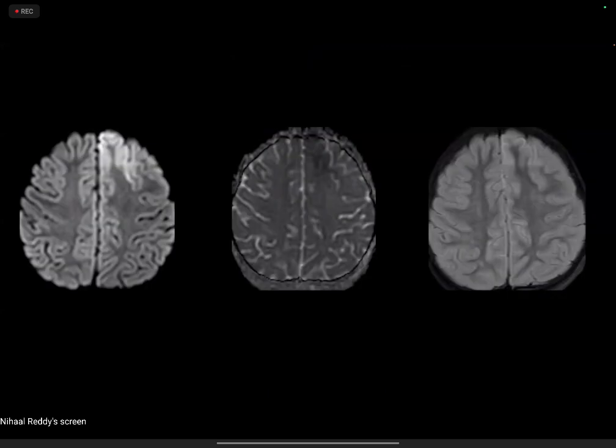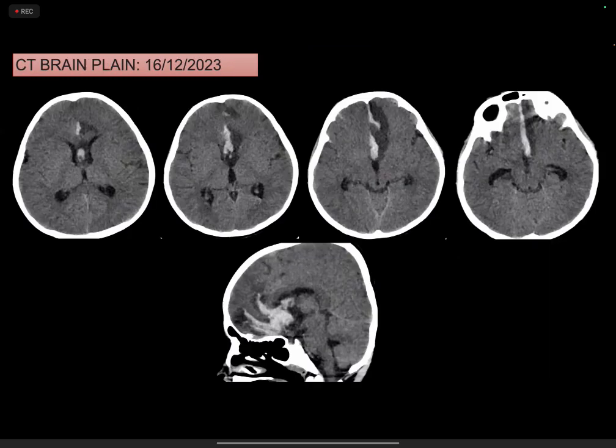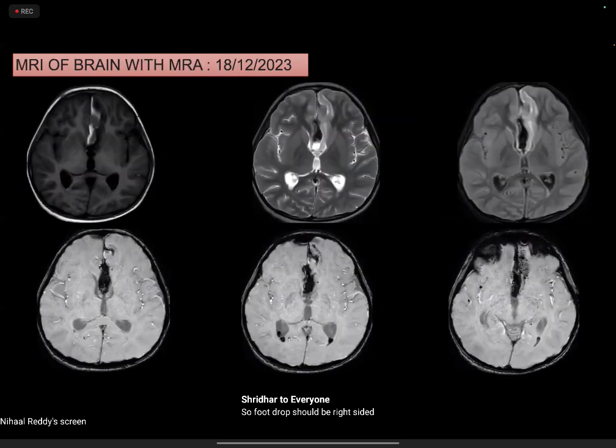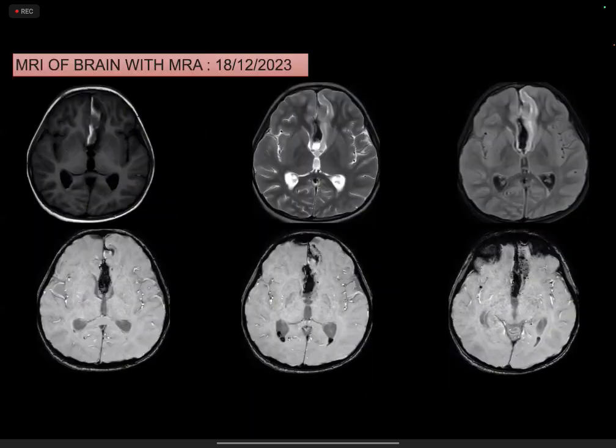Is there injury to the pituitary stalk, which explains the central DI here, because the location of the hemorrhage is quite close to all that? MRI doesn't have a SAG, but here it's possibly going up to the suprasellar region. I mean, Sridhar is right, but I think we should be looking out on MRI, particularly for any obvious disruption of the stalk. The ischemia of the brain associated with the subdural is fine because it causes a microcirculation problem locally with its pressure effects and all that. So you can get ischemia. That's not a surprise, whether it is subpial or whatever it might be.